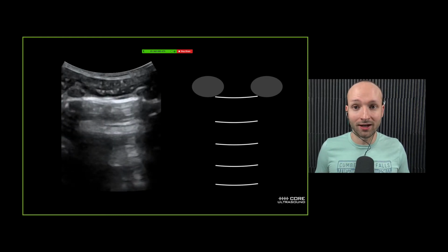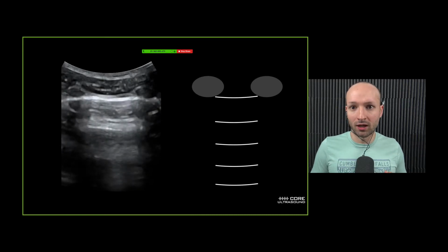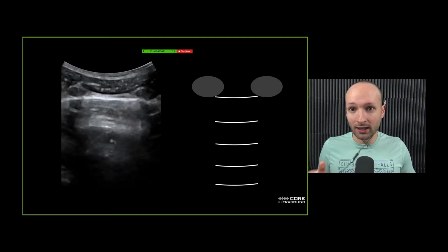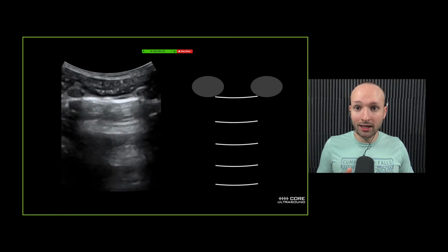So you can see A lines in COPD, asthma. You can see them in regions of the lung in a PE where you don't have any atelectasis or necrosis or anything like that. You can see them in a pneumothorax even. So A lines do not mean normal.